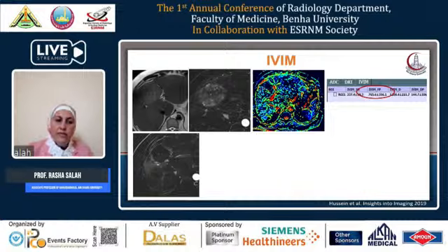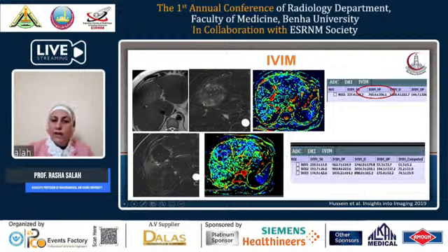And after treating this lesion by TACE, this is the arterial phase subtracted image showing a complete treatment of this lesion with no appreciable enhancement noted. And the IVIM data correspond to the dynamic study, with the significant reduction of the FP value located over here compared to the initial data. And this indicates that the lesion is well treated with no appreciable residual viable tumor inside.